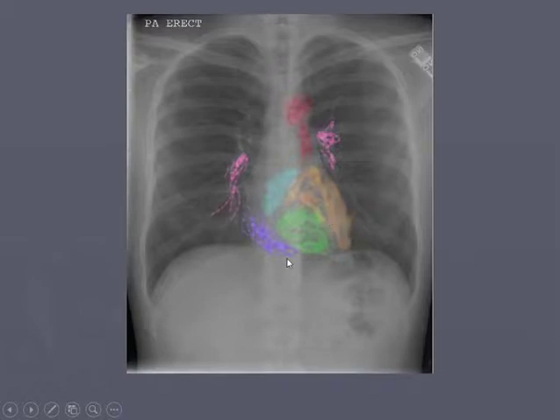So if you see something kind of poofed out, you can tell if someone has heart failure, or, really can't tell cardiac mass or anything like that, but this is about the general location of the chambers of the heart in a chest x-ray.